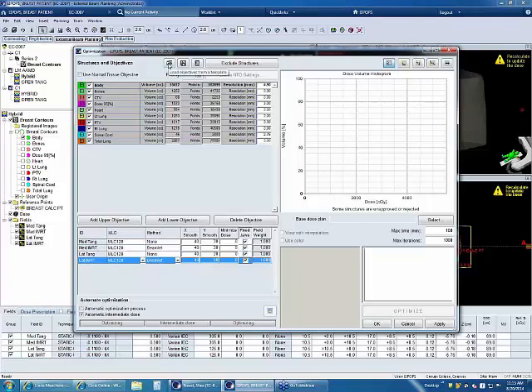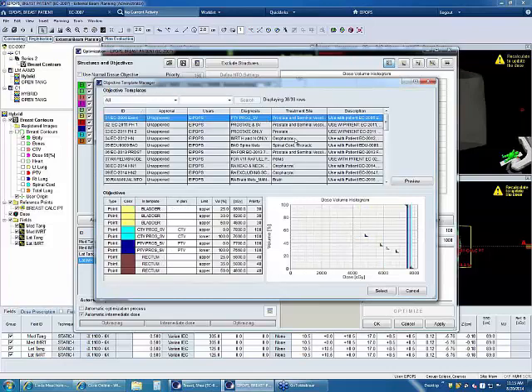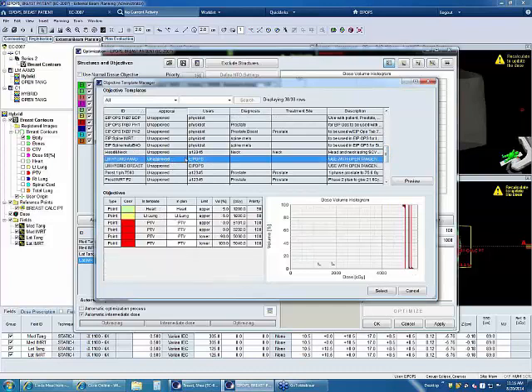Templates are really nice to have, especially when it comes to objectives, because if you have a template for objectives, it's a lot of tedious work that you don't have to do. So all I did was go up and say load objectives from a template, and I'm going to come down and get the one that I created for us right here. Let me see. This one has a heart and a lung and my PTV doses. That's all I need to do. I'm going to say select.